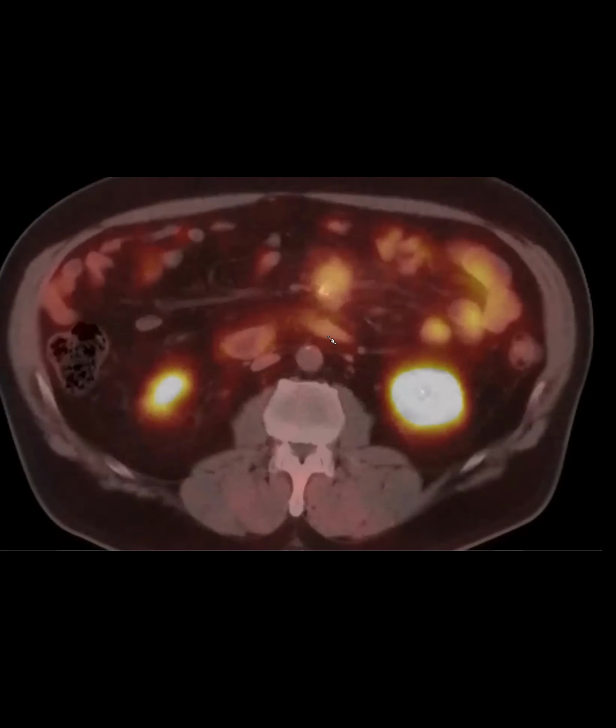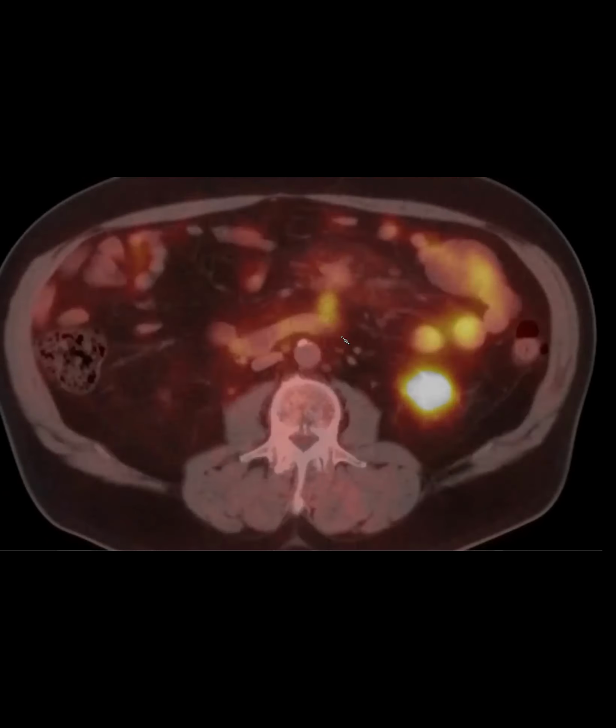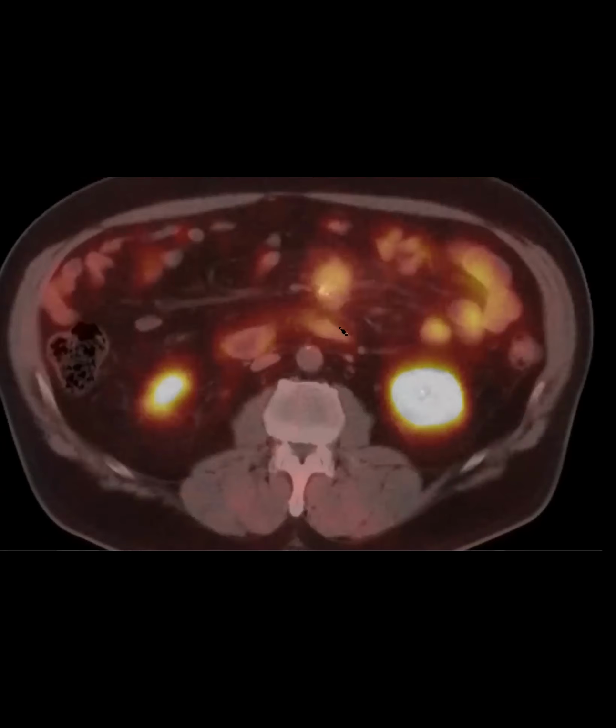And I would say that isn't exactly correct. So two things. One, if it's not very hot, then it could be a neuroendocrine tumor, but it would be more likely a more poorly differentiated neuroendocrine tumor, not a well-differentiated one that has a lot of somatostatin receptors. And the other thing I learned is that sclerosing mesenteritis can be avid because it has macrophages, and also some lymphocytes can have somatostatin receptors.